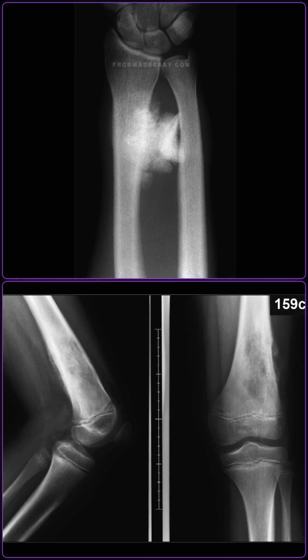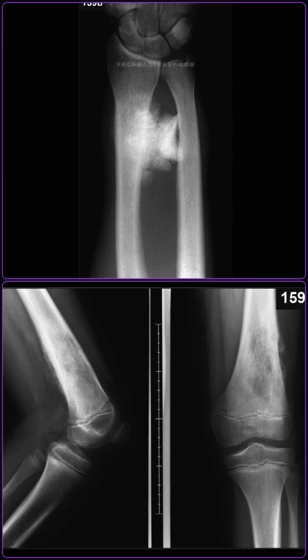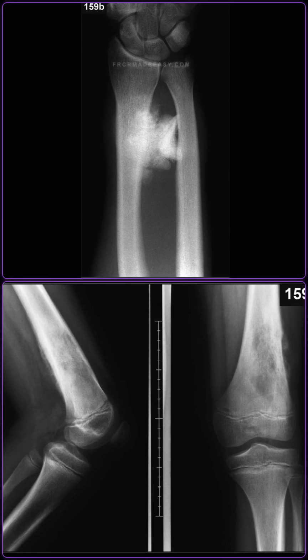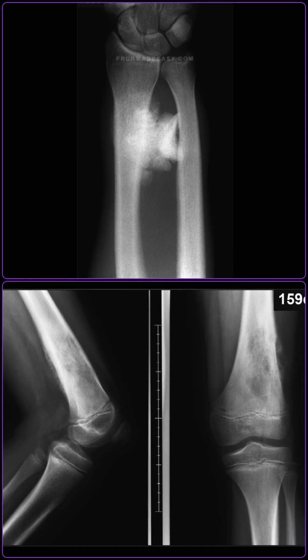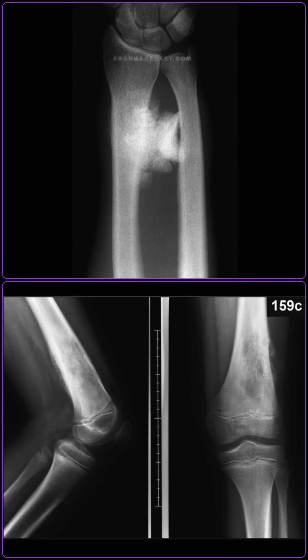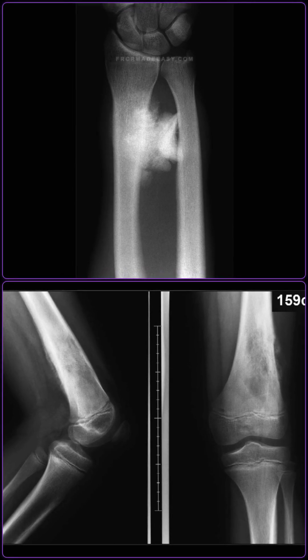This conventional osteosarcoma demonstrates aggressive features including mixed osteolysis and sclerosis, cortical destruction, a huge soft tissue mass, and a sunburst periosteal reaction. Conventional osteosarcoma originates from the medullary cavity and is highly aggressive, whereas parosteal osteosarcoma is a slow-growing surface tumor. Discuss the epidemiology and clinical prognosis of parosteal osteosarcoma compared to conventional osteosarcoma.